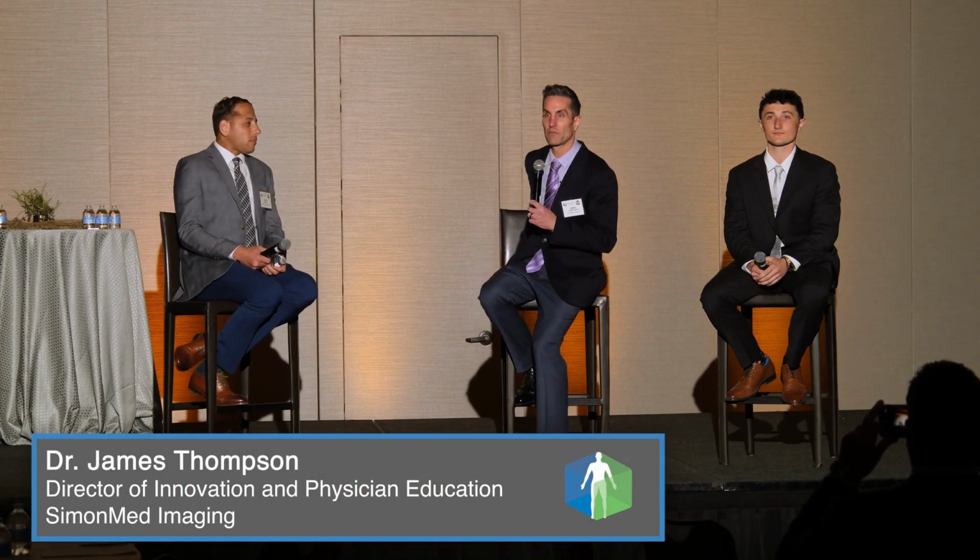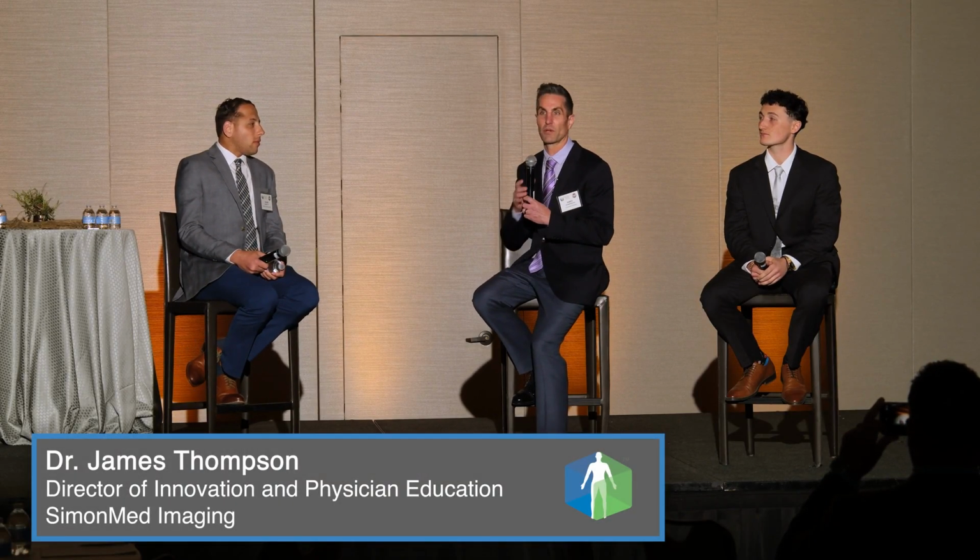Thank you for coming. We wanted to showcase some of the software applications that we use to process the CT data that we've been talking about, in a different way. This is the post-processing that occurs to take a look at the 3D lab that's done to look at the coronary arteries before some of the applications that you saw earlier with FFR and things like that.